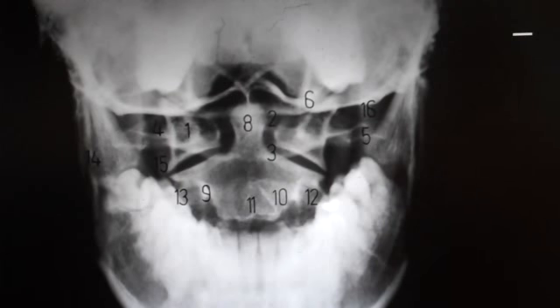The view that I'm covering now would be the A to P open mouth view. Before I start going over structures, the first thing I want to discuss is how the film is taken and in which direction the film is read. This film is typically taken anterior to posterior, A to P, and it is read P to A, or posterior to anterior.